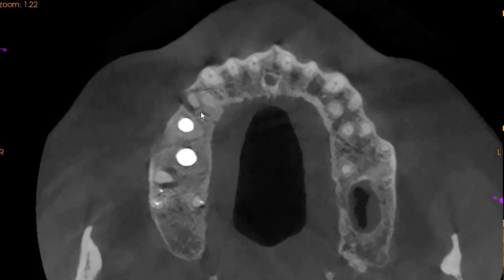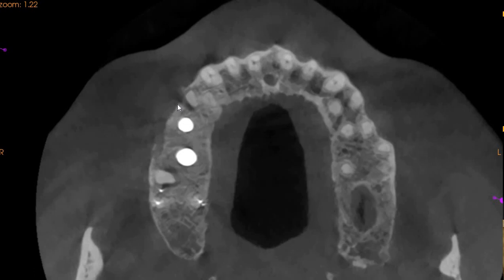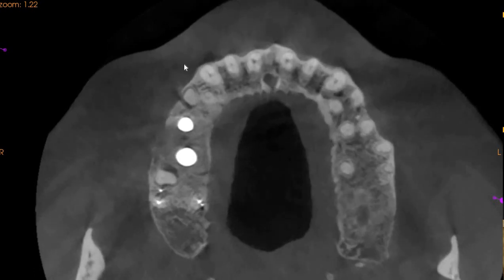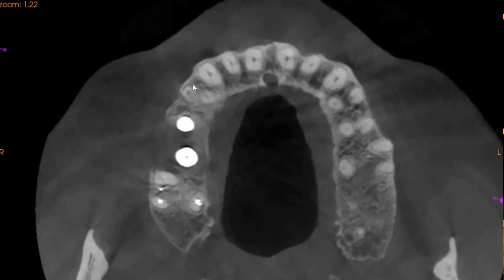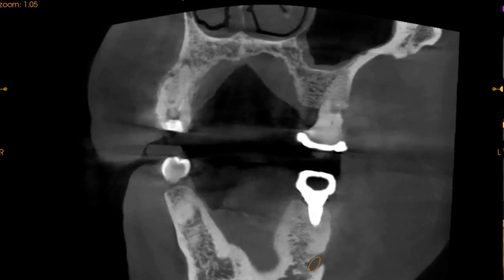We don't see a crack this deep, but we do see that the radiolucency is creating an endoperiodontal lesion on the buccal root. Now, the buccal root is quite significantly shorter in height as well. You can see here that this is the buccal root. The working length of the buccal root will be approximately just 16 millimeters, and the working length for the palatal root is going to be 20 millimeters. So there's a huge difference between the length of the two roots as well.